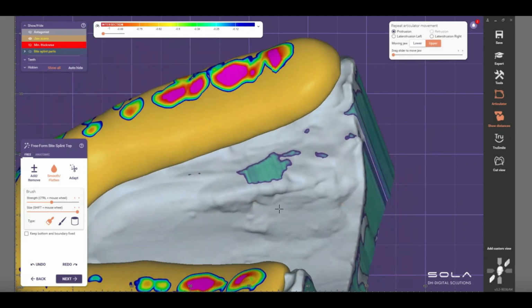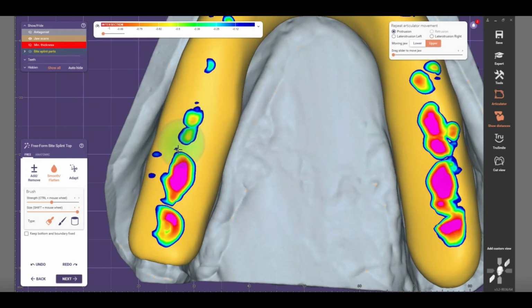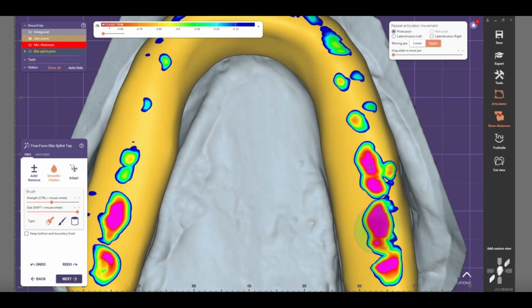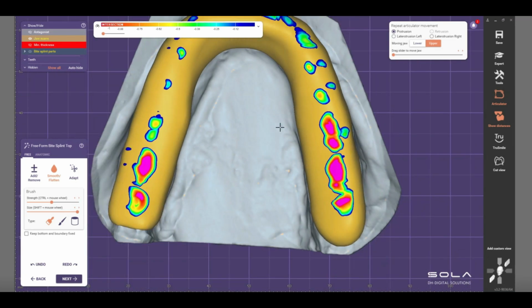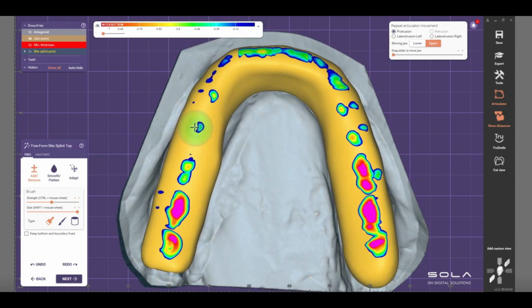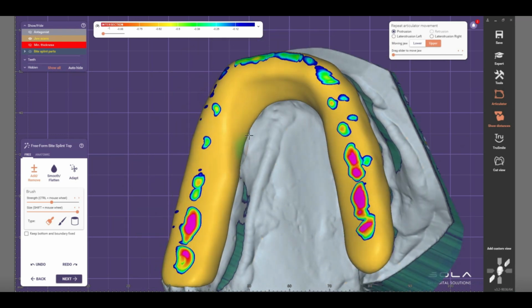There. And I'll also smooth if possible on the top again. Make sure they are flat. Make sure they are flat again over here. If they are less in contact, and if I add more, I can add slightly over here. Make sure they're added back on. Just make sure that they are symmetrical on both sides and looks nicer.